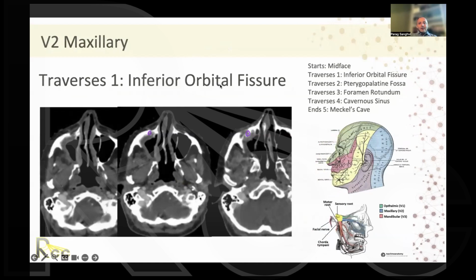This is now, again, showing you some images of this on the axial slice. These are very easy for us to see because we're all very used to contouring head and neck cases. Here you can see the nose, the nasal cavity, the maxillary sinus, and here is that foramina right here. Right along here is where that foramina is going to be.